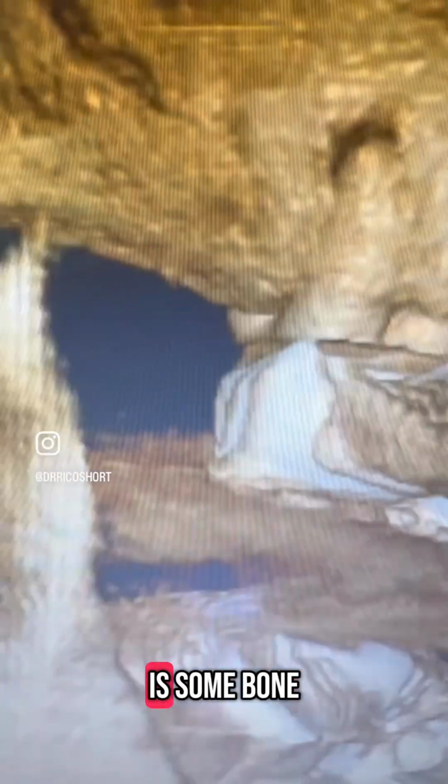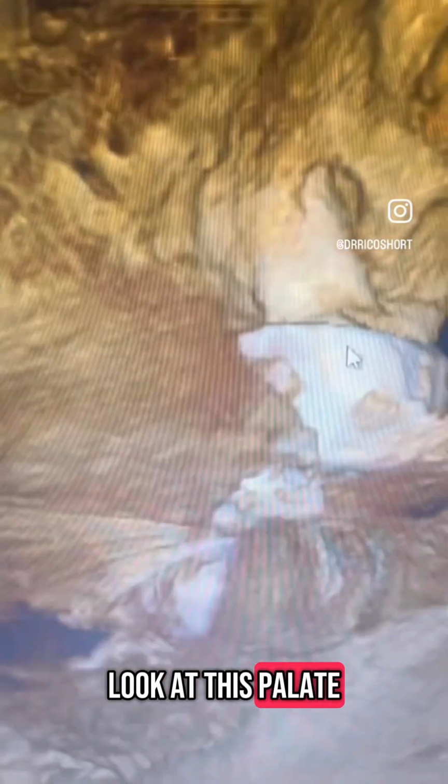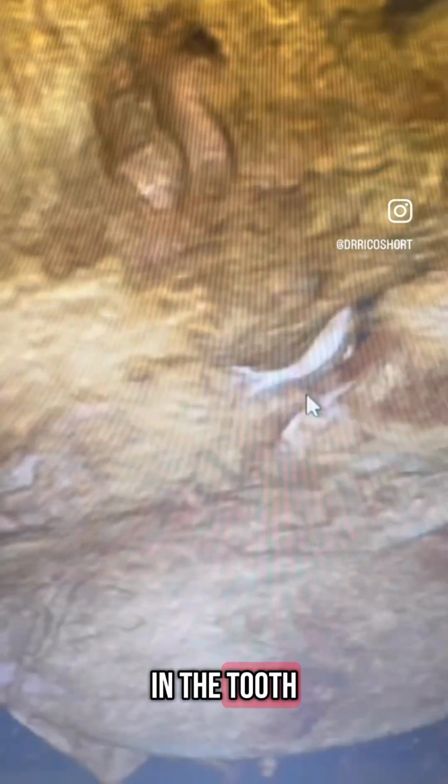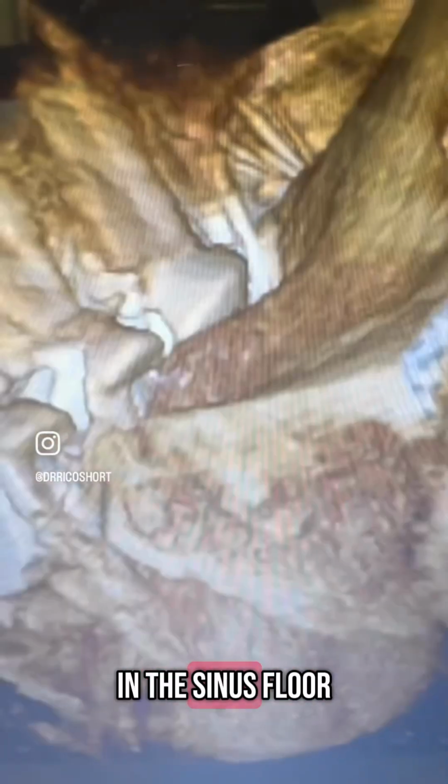We can see there is some bone loss associated with the pathology here on that buccal aspect, and also look at this palate aspect, look at this bone defect. And this is all due to the diagnosis of what's going on in the tooth, which is a necrotic pulp with chronic apical periodontitis. Look at all this bone destruction in the sinus floor.